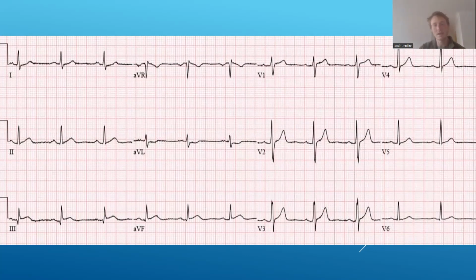The way I like to do it is I start at lead 1 and look at my high lateral leads, which is lead 1 and AVL. Look at my inferior leads, look at my septal or anterior, which is V1, V2, then look at my anterior, which is V3, V4. Sorry if I get that confused. We refer to V1, V2 as septal leads and V3, V4 as anterior leads where I trained. But in the UK, V1 to V4 is anterior. So I'll try and use that UK nomenclature from here on out. But if I do misspeak, I do apologize.